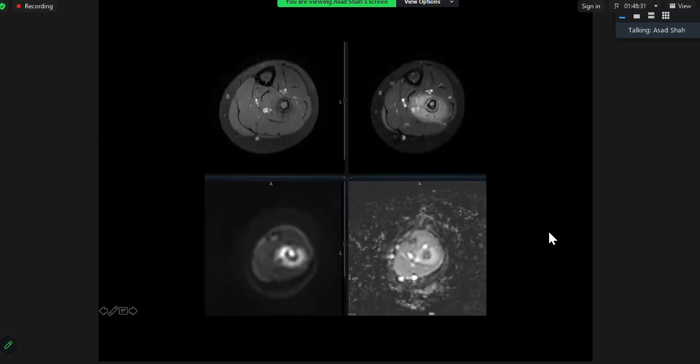Okay, let's go forward then. So this is pre-contrast. You guys can see my cursor? Yeah. All right. So this is T1 fat suppressed pre-contrast. This is post-contrast. And these are diffusion weighted images, DWI and ADC. Describe what you see and then let's close the differential diagnosis. So I think it's showing central diffusion restriction, and on the post contrast sequences, there is peripheral post contrast enhancement.